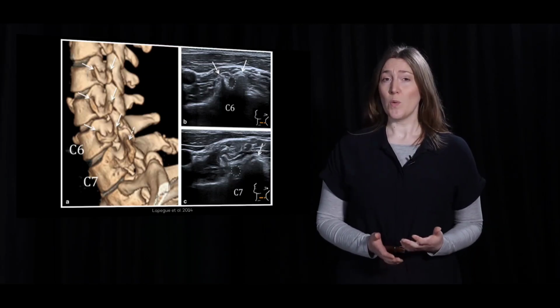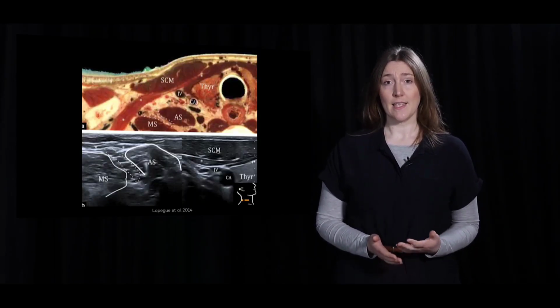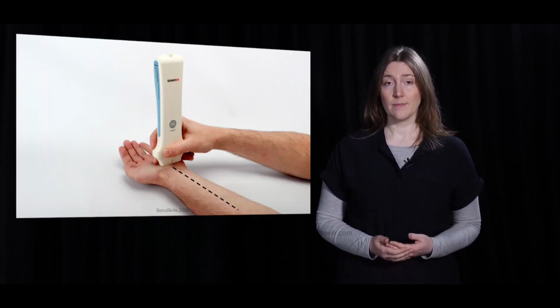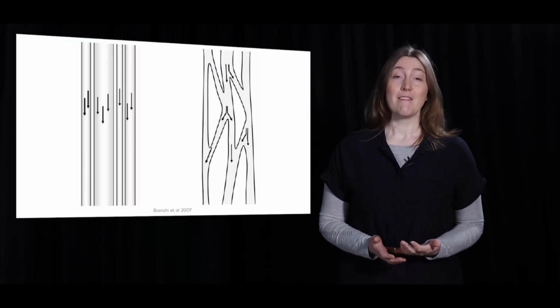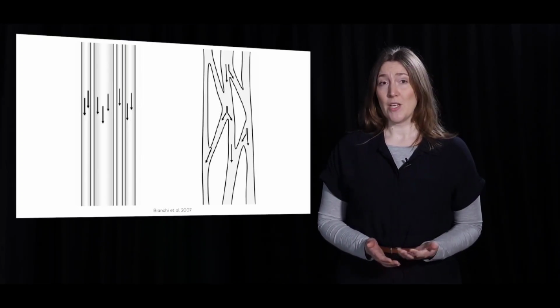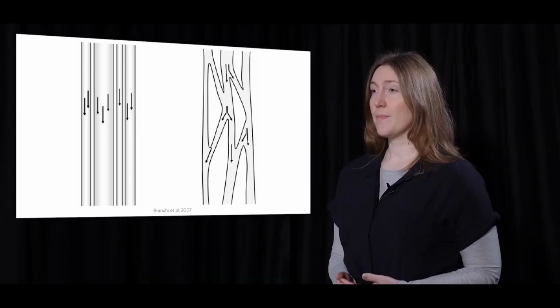Nerves can be followed all the way from cervical level, passing the scalenus muscles, leaving the axilla and looking for their path in the upper arm, all the way down to the wrist into the carpal tunnel. Nerves are very adaptable and variable. They search their own path in the anatomy, where they seek a combination of protection, backup possibilities and functionality.